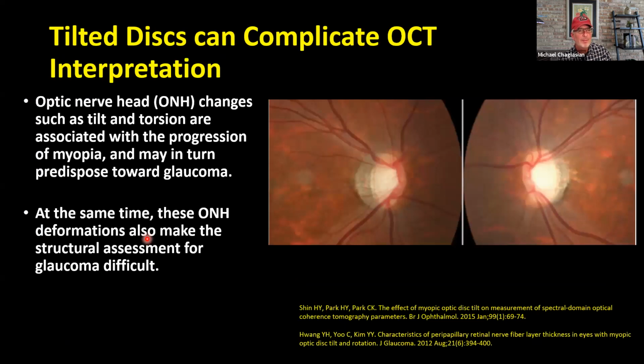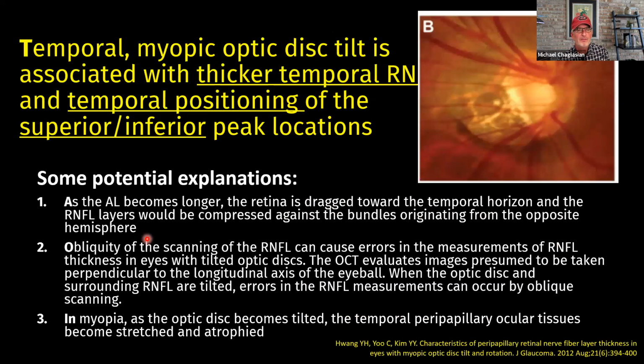Tilted discs are a big thing. They really do complicate the OCT interpretation. When I prepared for this lecture earlier in the year, there's a whole host of articles that reminded me of these changes in the optic disc and how these are the hard patients to evaluate. You see the photographs here, and there's a whole host of explanation about what's going on in there. The bottom line is that you have to be really careful.